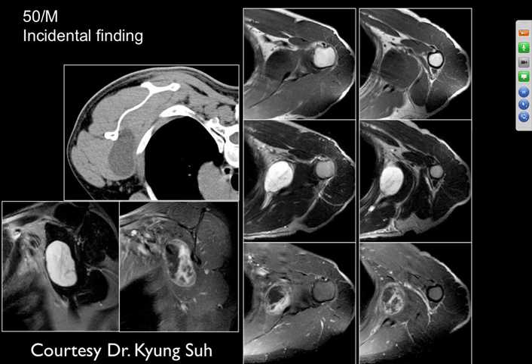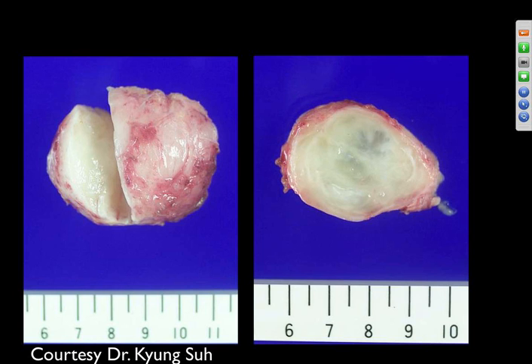No. It's sort of more rounded, mass-like. And this could be another nerve sheath tumor, or could be a sarcoma of some kind. It's very low in density. It looks like water on the CT. Kind of bright on the fluid-sensitive images, dark on the T1s. It looks like it's in the muscle. Mm-hmm. That could be what it looks like. Could be sequelae of a hematoma as well.